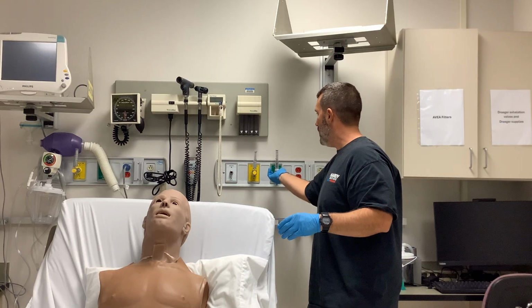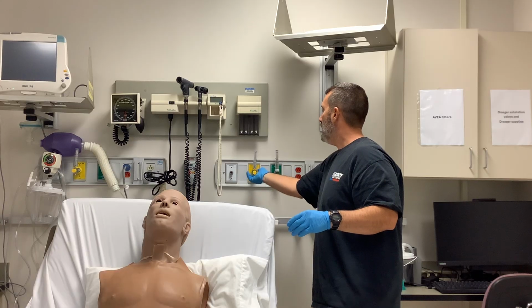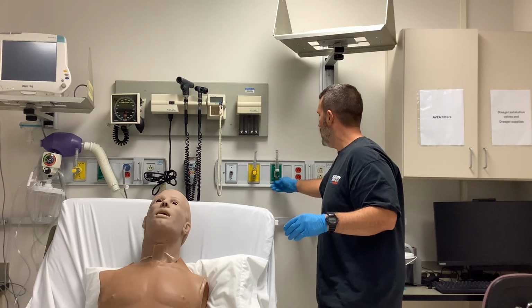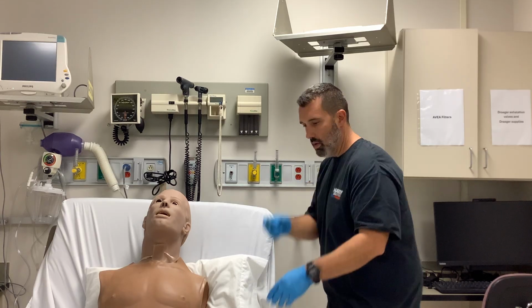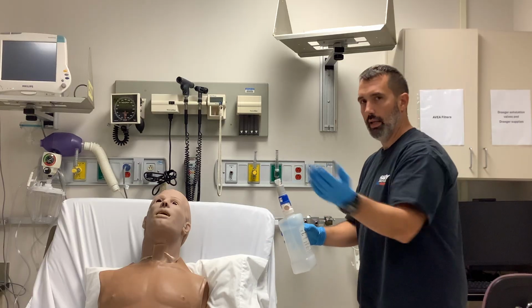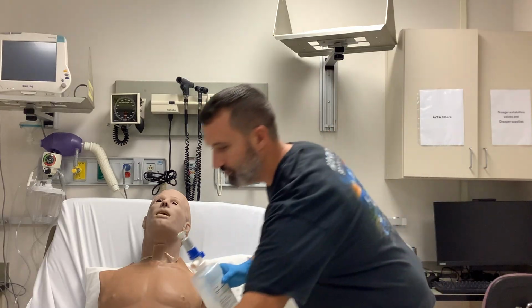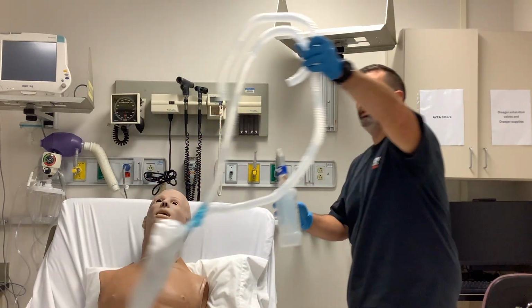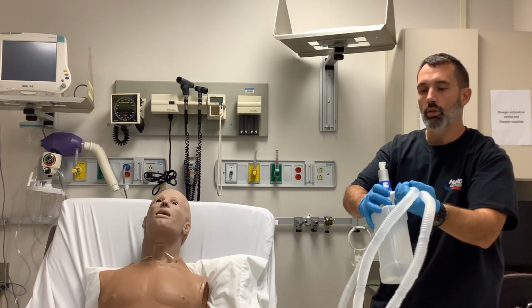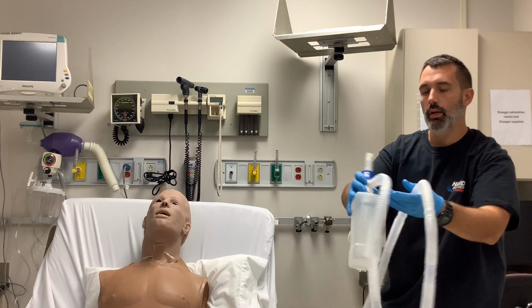So let me turn these off, and we'll apply the large volume jet neb. Again, your aerosol tubing would hook here, your drainage bag, like I showed in a previous video, and your corrugated tubing is going to attach there.